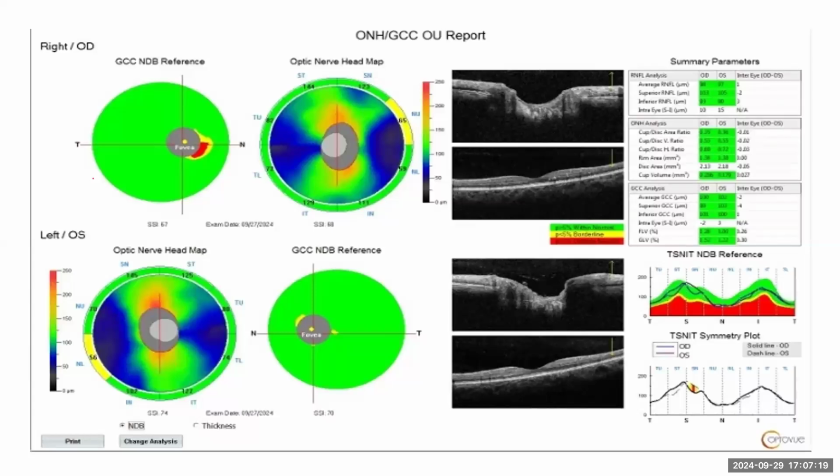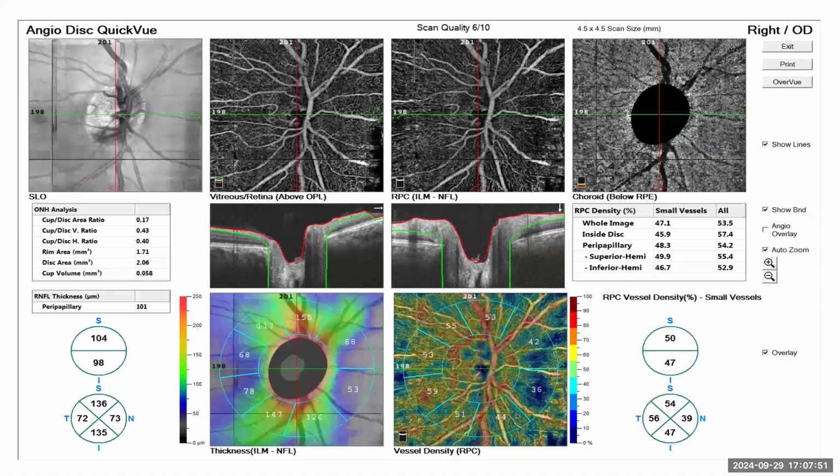I'm putting the retinal nerve fiber layer thickness first, so that you look at it, and then we'll look at the OCTA, and then we'll talk about it. Okay, so this is the retinal nerve fiber layer thickness. The average for the right is 98. That's nerve fiber. The average for the left is 97. I've removed the biodata part of the patient, but I'll tell you.